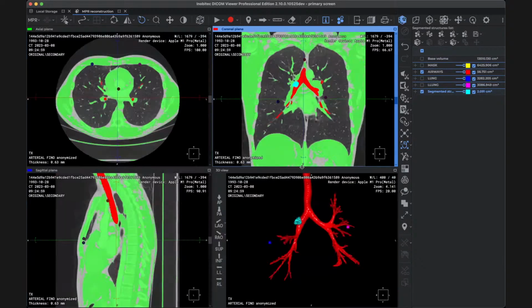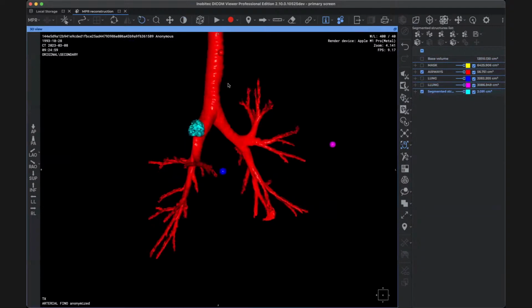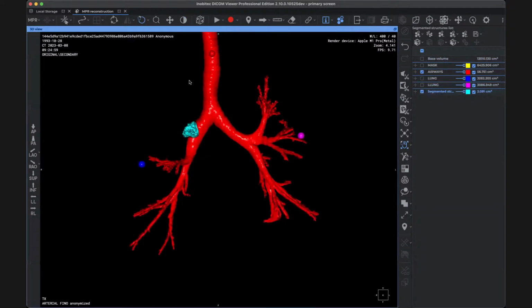Enrique, sorry, can I ask you a question? Sure. Do you use the same settings for the mask depending on the case? I mean, for the tumor you use these parameters to segment the tumor, for the airways another parameter, for the bones a third one.